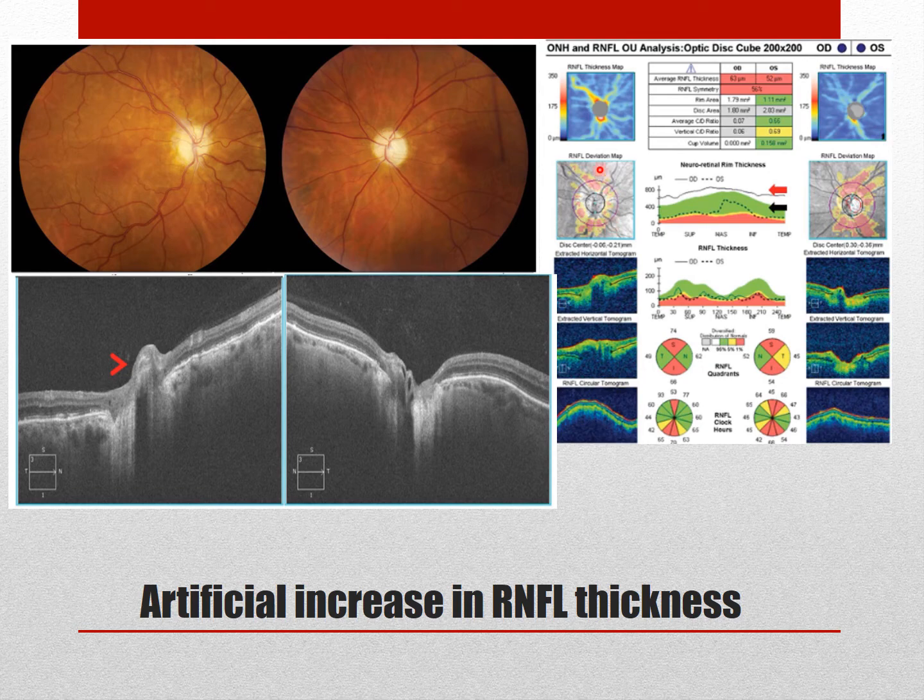But it's weird, because you see a lot of loss here, but I feel like there should be more. But we'll see. Here in the left eye, yep, it looks more dead than the right eye, and you see that too with the deviation map. Lots of red, lots of nerve fiber loss, and this seems to be true. Let's keep going.